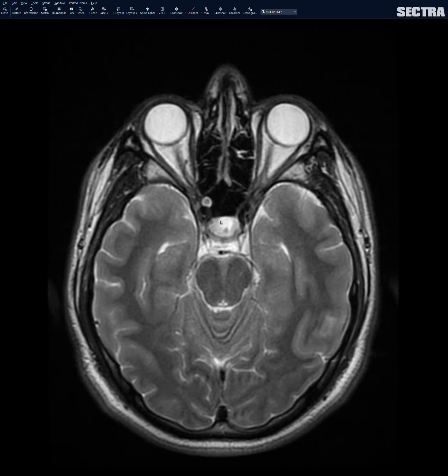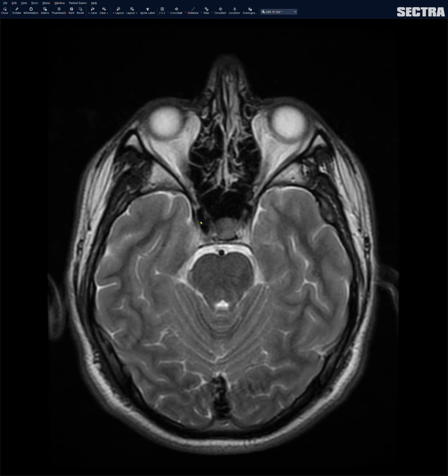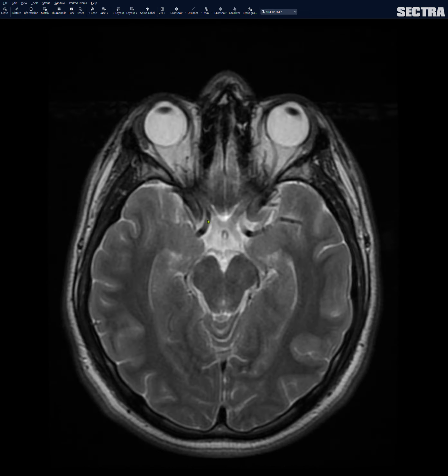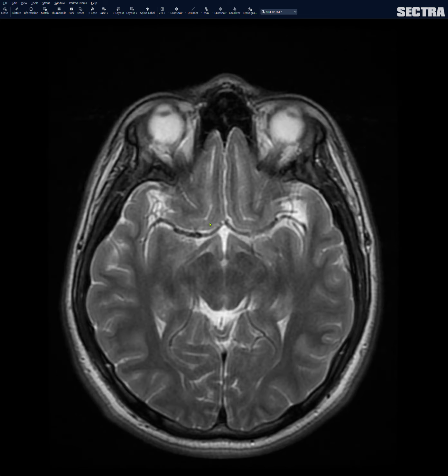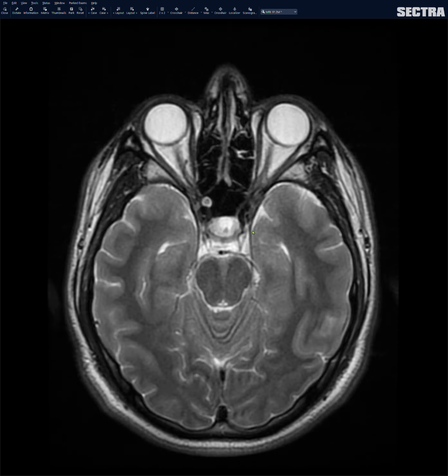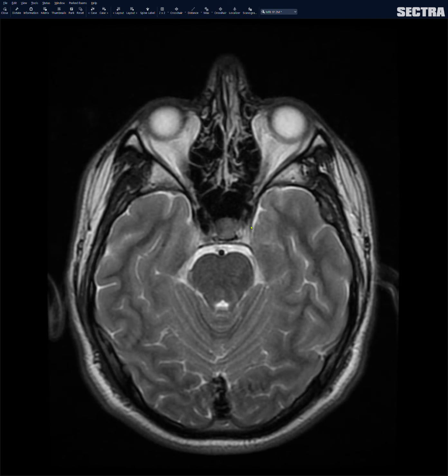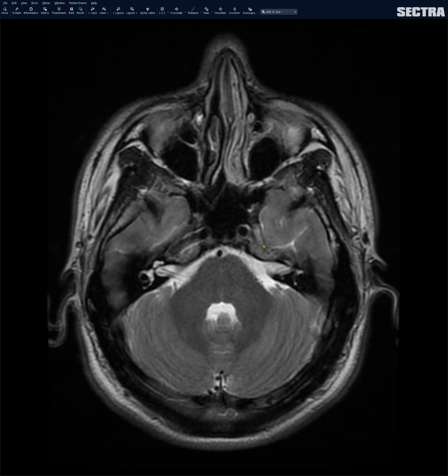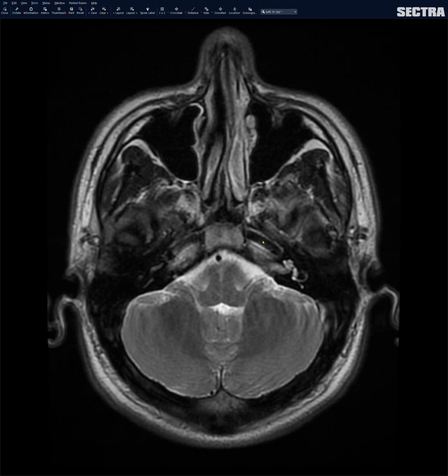And then after this, I look at the internal carotid artery flow voids. See that? There's supposed to be a flow void of the right internal carotid artery along its petrous segment, along its cavernous segment, and in the communicating segment. Make sure there's a nice flow void. Look at the MCA for a nice flow void. And of course, if I don't see a flow void, the vessel might be occluded. So I look at the left MCA flow void, the left ICA flow void, in the cavernous segment and also in the petrous segment. Every once in a while, you can catch occlusion of the ICA on an MRI because of loss of that flow void.